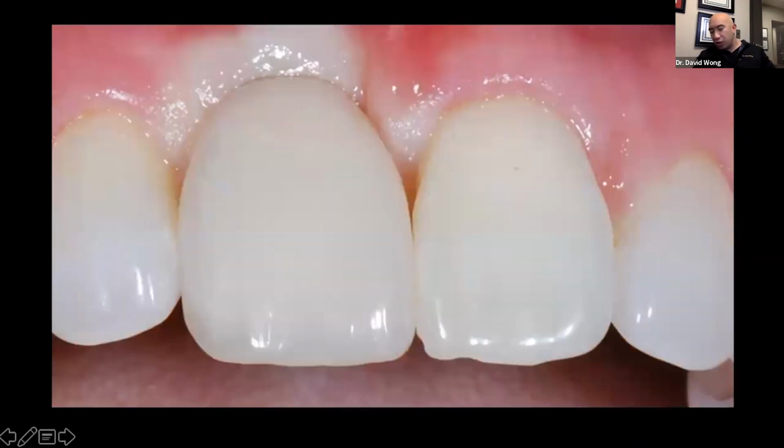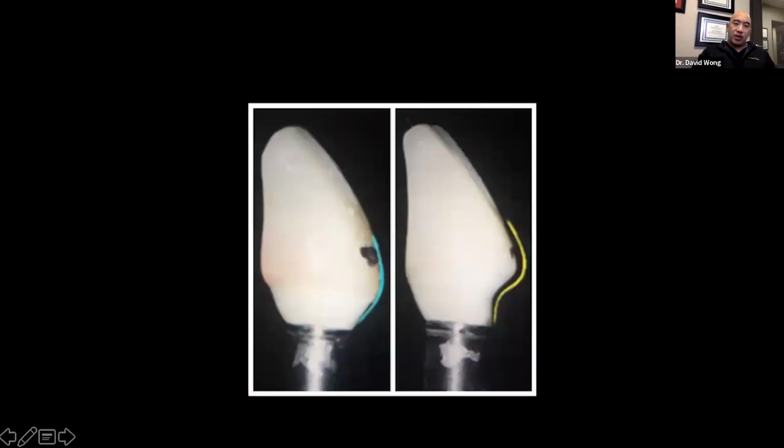So what happens here is I'll hear dentists tell me that the crown looks too big, the tissue blanches. They had to give the patient anesthetic just to get the crown on. And once they got the crown on, the tissue went up. Okay, so that's a pretty common thing that we see. And then I'll take the crown off, and now often it'll look like the one on the left here. Once again, it looks exactly like a tooth would, which I get. That's how we're trained. It's kind of a habit, but keep in mind, upper implants don't look like teeth.